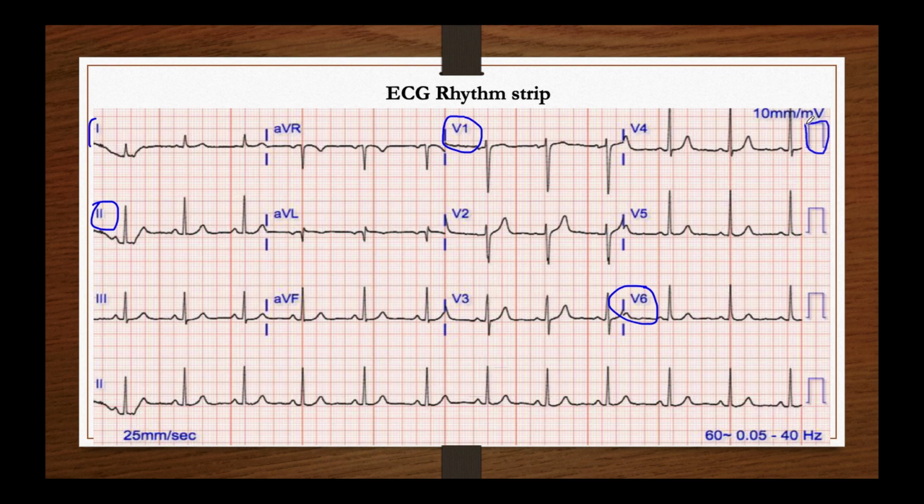This diagram over here, you find it on all ECGs. And this calibration spike tells us two main things: the speed of the paper and the standard amplitude of the ECG. And the normal calibration spike must be 10 millimeters tall, as we've seen before. Each big box over here is 0.5 millivolts, and so the normal calibration spike must be 1 millivolt, so it must be two big boxes in the vertical direction. So we have 1 millivolt or 10 millimeters.